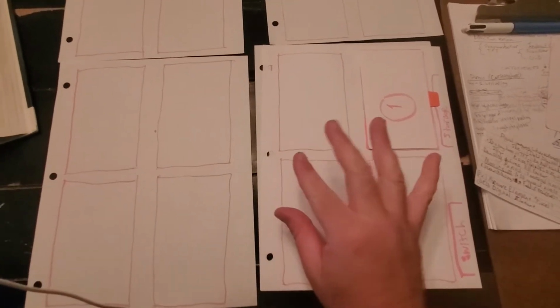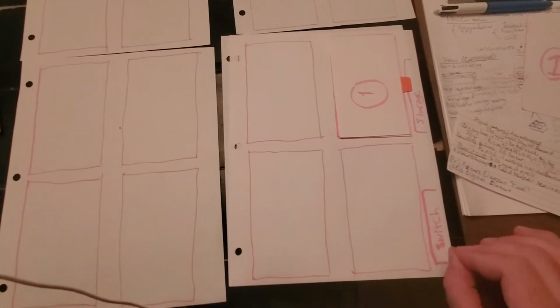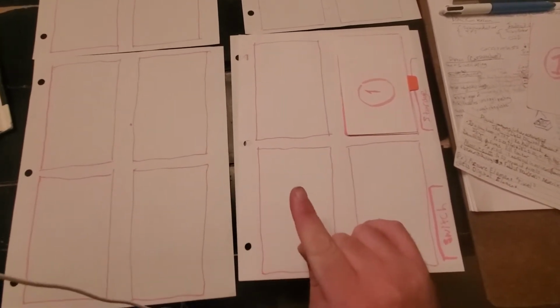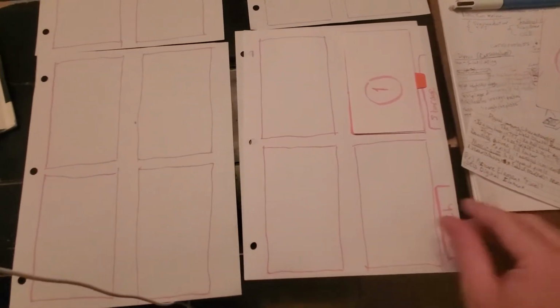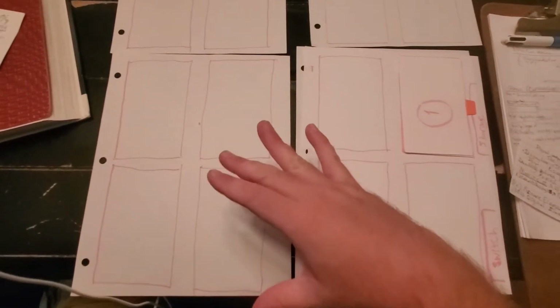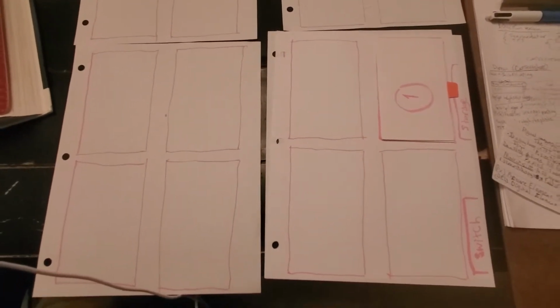So you've got pixel, you've got the pixel density, you have the fill factor. You have the matrix size, which is basically the 2D array of pixels.